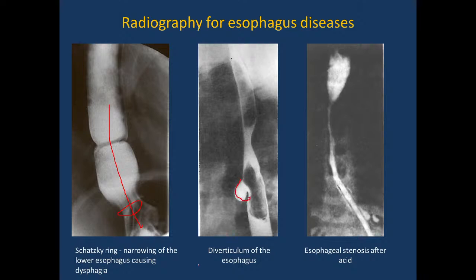A very rare situation when the esophagus has a special recessus, or we call it a diverticulum here. And this is a tragedy, this is a stenosis after acid. You may ask me what kind of acid. Usually it is after suicide attempts, when people try to drink acid and stay alive, but get difficult stenosis after that burning. We call it chemical burning here. Don't do that, never.